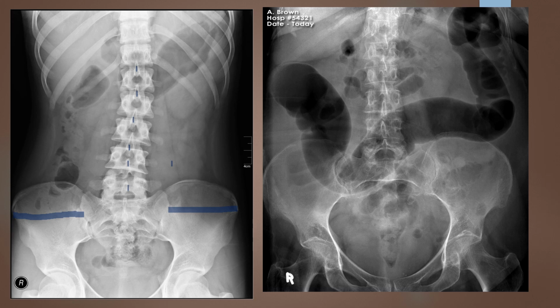Usually I'd come down here and I'd look at the coccyx and I'd see if it matched up directly with the pubic symphysis, and that would be key. Since I can't see that, I'm out of that opportunity, and so I'm going to look at these ischial spines. So these are the ischial spines right down here. And these are on the posterior aspect of the pelvis, and when the patient rotates, those ischial spines will move posterior to the pelvis or farther out.